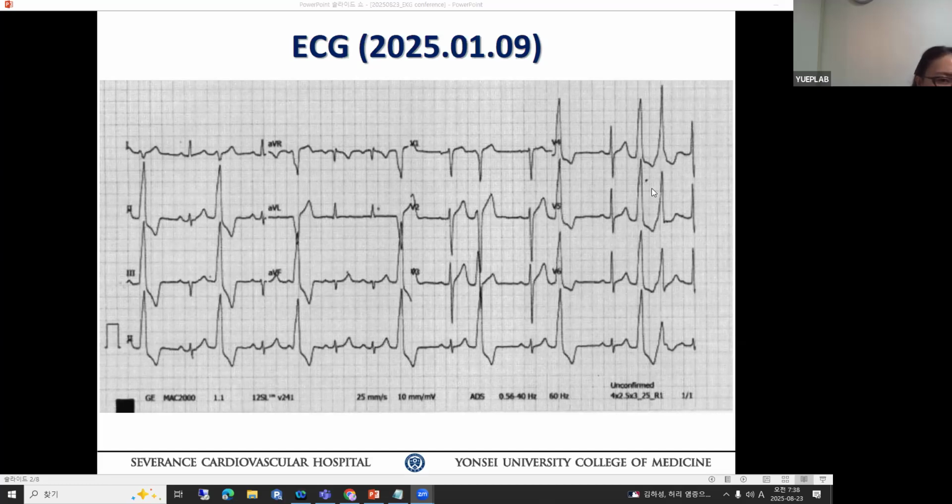Now, look carefully. What is the end of that second complex, P? That's a P wave downstroke. Can you point the arrow? This one? I think this is the arrow. Which one? This guy here. Yeah, that guy. End of a T. You do one. I don't think that is a P wave. That's a P wave? No, it's not. Okay, so that's a possibility you have to discuss as well, right?